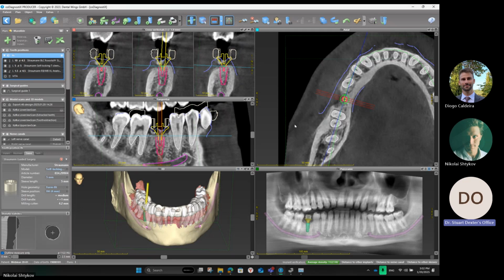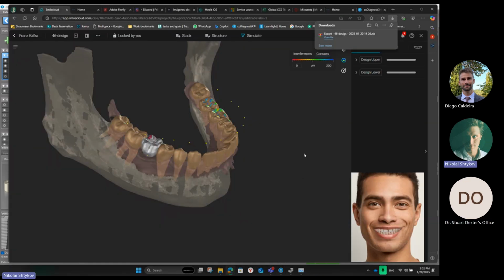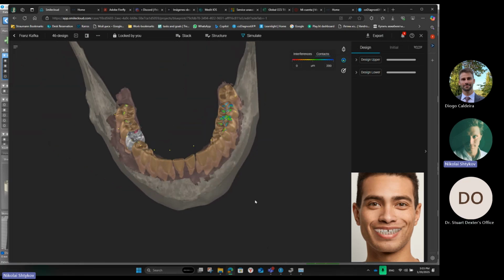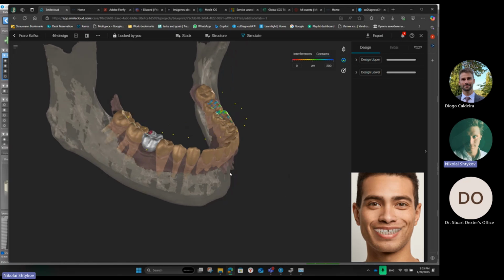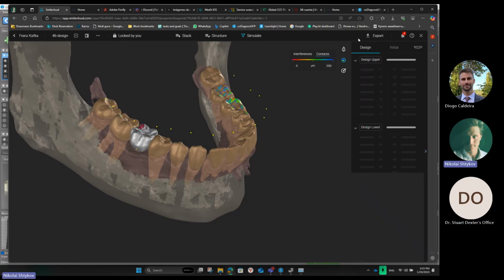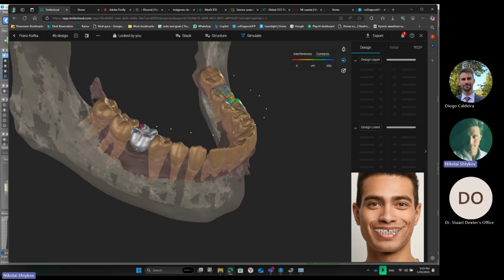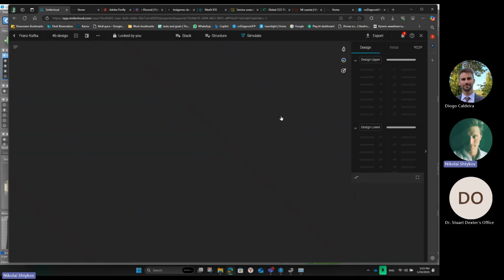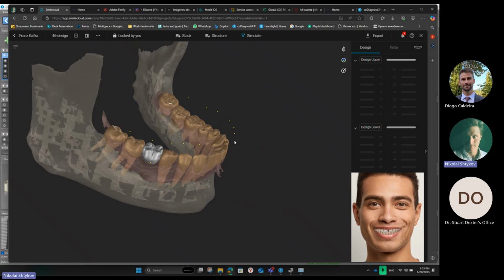One last thing, could you show us again, because you did it kind of quick, how to get to that Smile Cloud app? Yes, I can. In SmileCloud, but here is actually the function as I showed you here. This function is not released yet because this is 3DNA, where we can also design the smile of the patient. But for example, here I just designed the lower teeth, and we can export with everything.